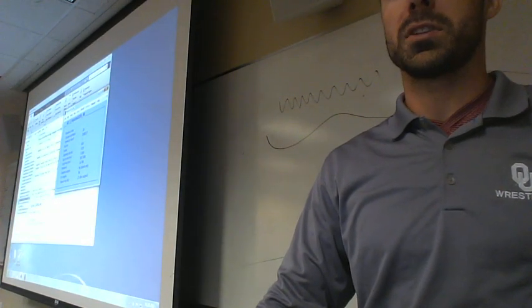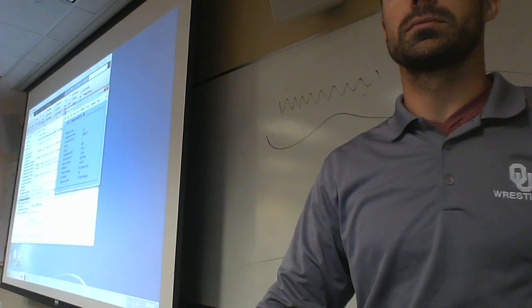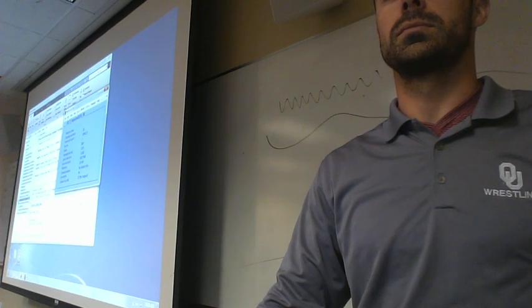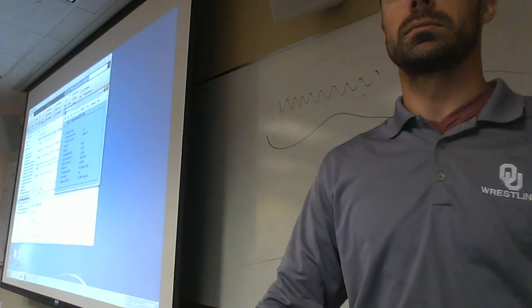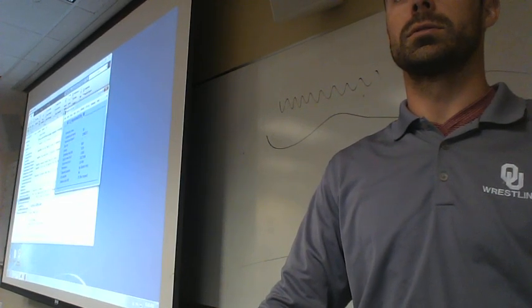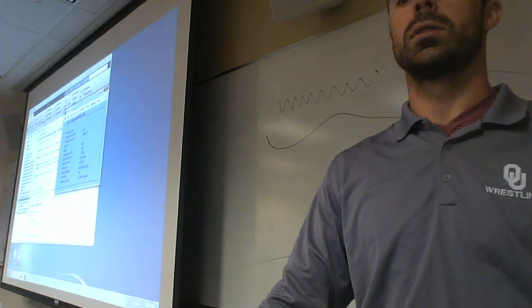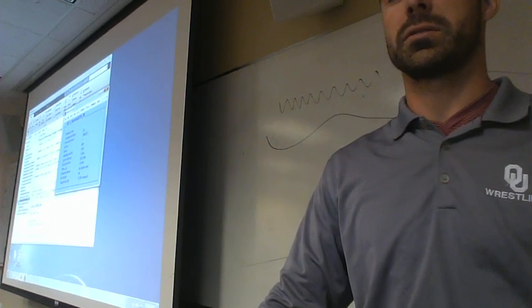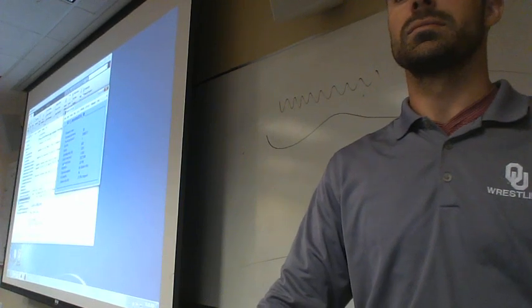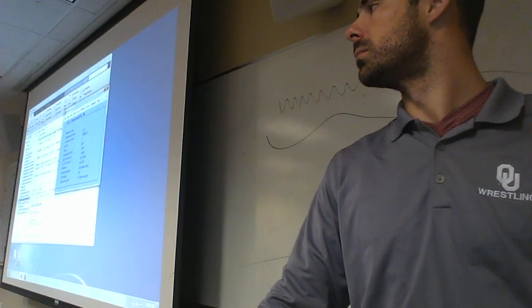But yes, Val. I have on the window that we're chatting: some changes have not been saved. What do you want to do with the old data set? Overwrite it in memory or save it as file? I would just overwrite it for now. It's fine. Could you do this part again, please?